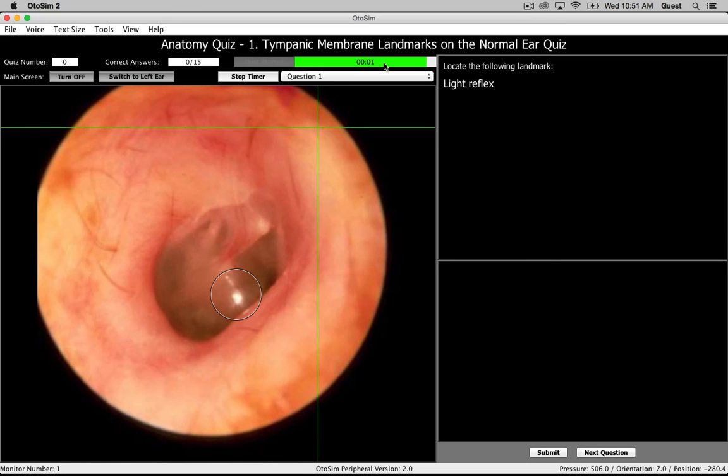So if I run out of time, you'll hear it gives me the buzzer, okay? But we're not trying to make you nervous in this part of the examination, but if you go back in the simulator and you identify it correctly, you hover inside for the time, you see now that it's turned green, so I've actually identified it correctly.